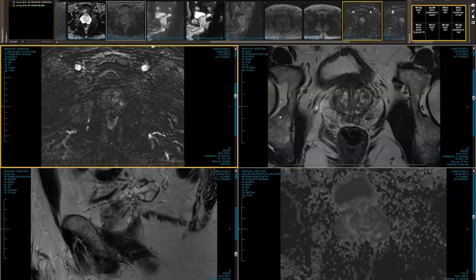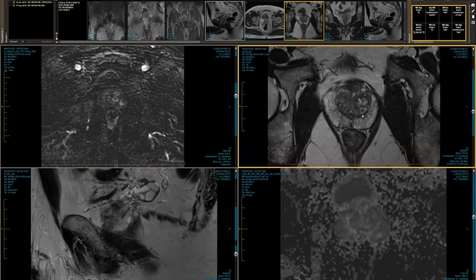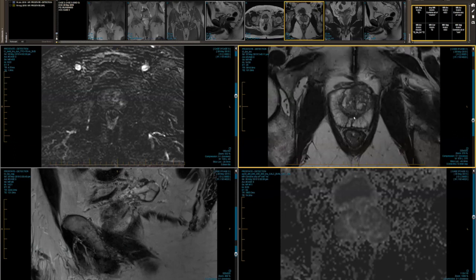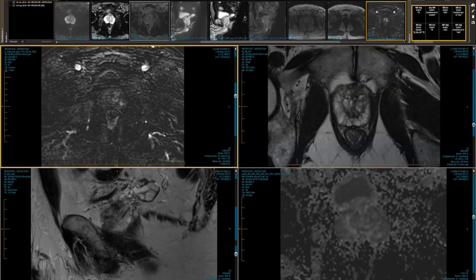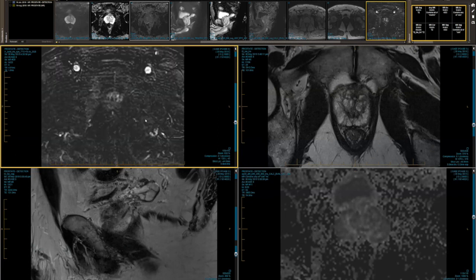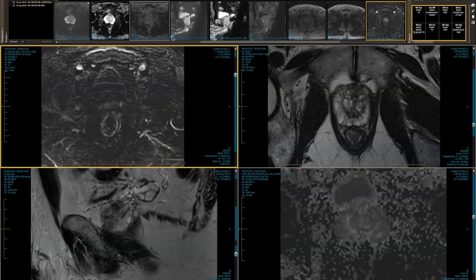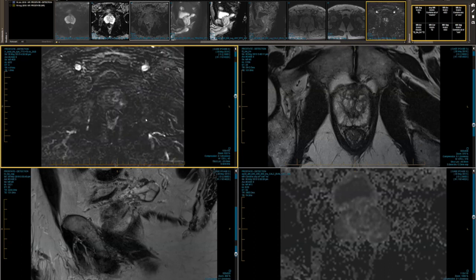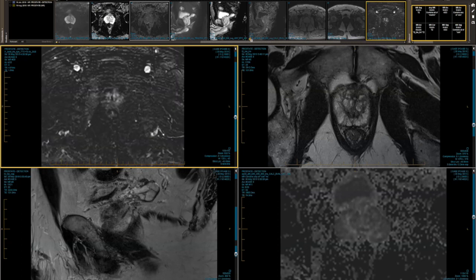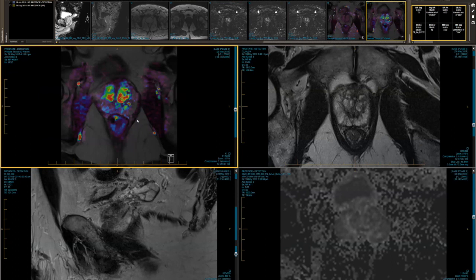And there's also something on the right on the capsule at about 7 o'clock. On the T2s? Yeah, on the GAD, I think. Okay. I can't remember quite where it was because I haven't seen the images. But it just caught my eye when you put the initial map up. There was something on the right, but I can't convince myself there's something on the right. So it will be revealed in the moment.